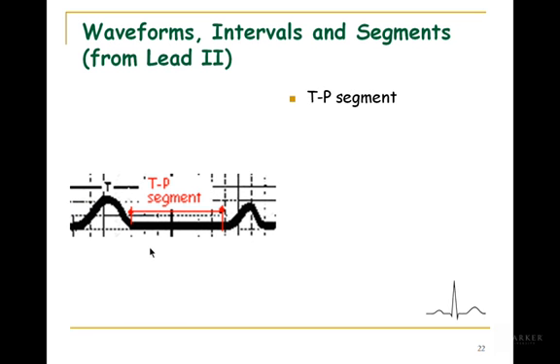Now, the T wave represents repolarization of the ventricles. You already knew that. It's not very symmetrical, it's usually a little asymmetrical. In most leads, it is positive, but it doesn't have to be positive or upright in all the leads. It can be inverted in standard limb lead 3, and you may also see it inverted in your chest lead V1 and not be concerned about it. The voltage shouldn't be more than 0.5 millivolts or 5 millimeters in height.